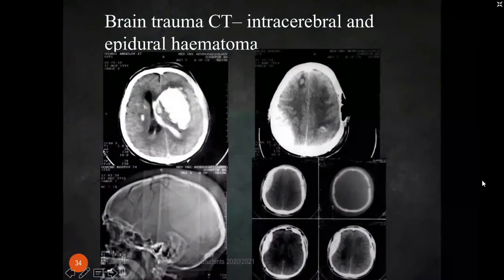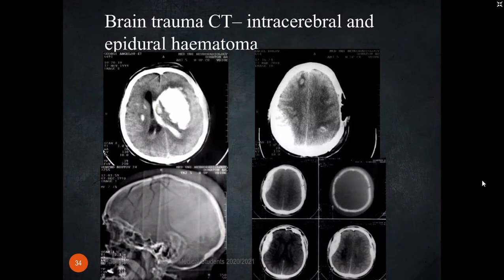So this is another example of epidural hematoma here with some blunt trauma in the first axial image. The hematoma is also intraparenchymal, and there is an important complication because the blood inside the white hyperdense structure is entering the left lateral ventricle, which is importantly displaced to the right side. And when we have blood inside of the ventricle, it should be treated by surgery. This situation is really a very important one.